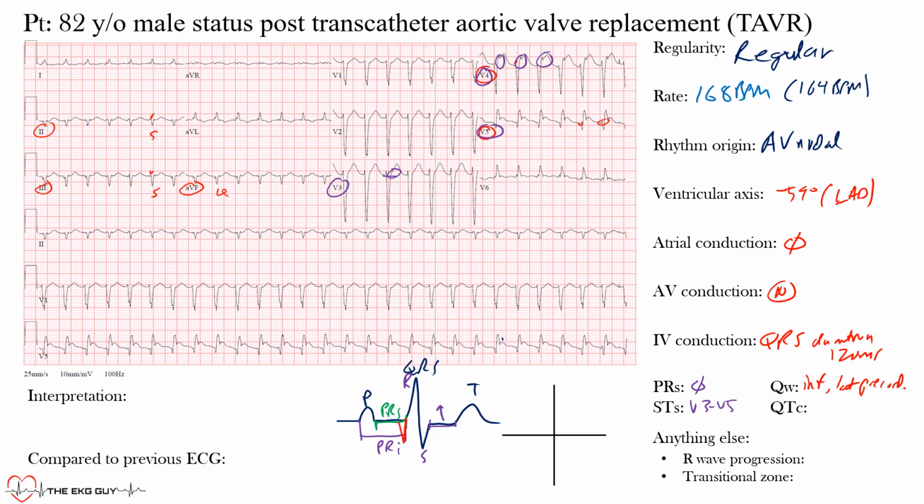Now the QT interval, we calculate, remember the QT interval is from the beginning of our QRS complex to the end of the T wave. This is the QT interval. We use the C to mean corrected. It corrects for the heart rate. We have a fast heart rate here. The QTc was actually 502 milliseconds, okay? So prolonged, because remember in males, as we have a male patient here, less than 440 is something that is normal. So this is prolonged in this case.